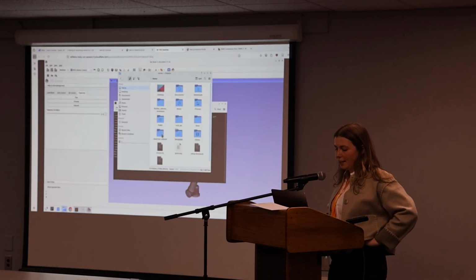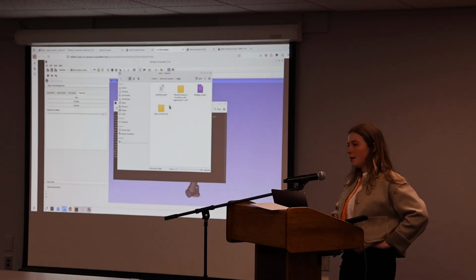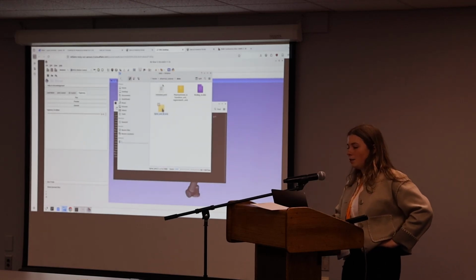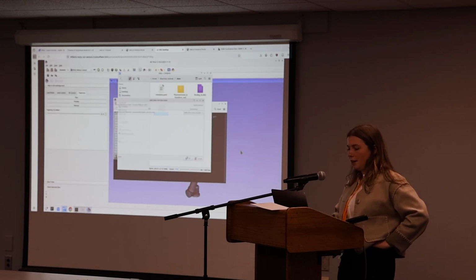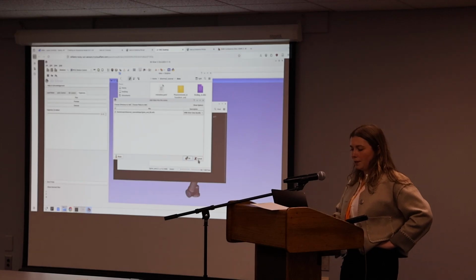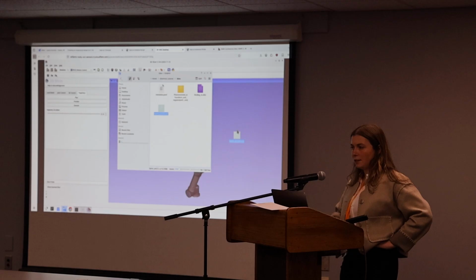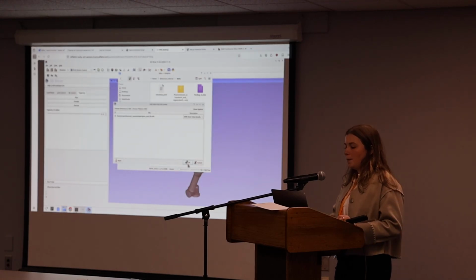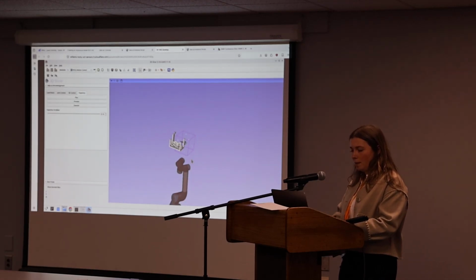Okay, so you should see this folder pop up, and then if you go into data, there are some scenes in here that you can load. These are pre-saved Slicer scenes. So you want to navigate to this spine and EE MRB. It's an MRB scene that will have a spine model, and EE is an end effector that we customized. If you just take the folder and drag and drop it into Slicer like this, it'll pop up with a window that says, do you want to load it? And you can just press OK. And then you should see some stuff show up.